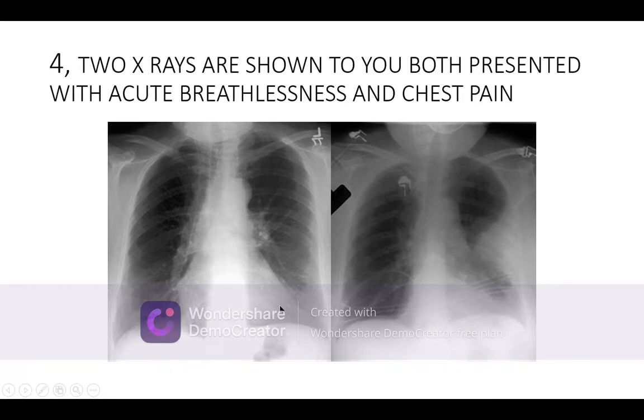You see, it is not Ellis's curve. Again, in this case, the curve is coming out from this. It may be mesothelioma. It may be something else, which is a benign tumor or a bronchioloalveolar carcinoma. Same thing. But look, this is what we call the thickening of the pleura.